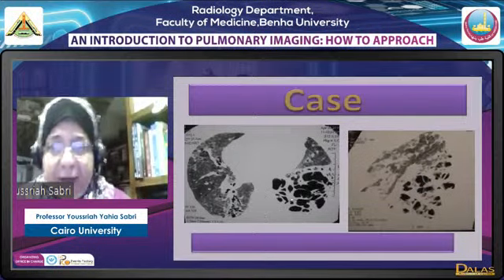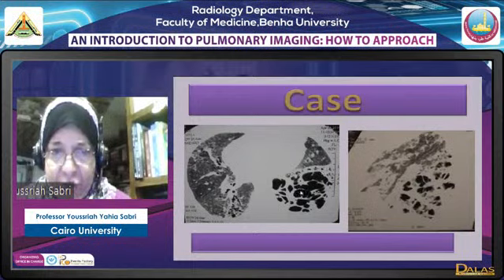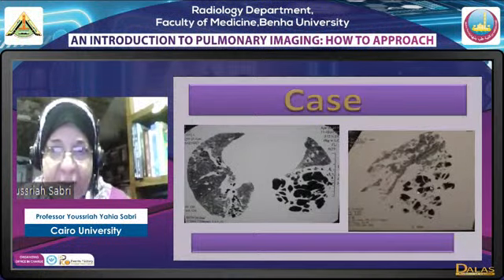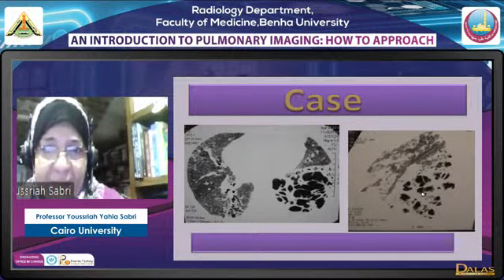Now we have a similar appearance here, multiple what looks like cystic, bizarre shaped cystic lesions together with opacities in between. But here we have shift of the mediastinum, of the fissure. There is mass effect here. The fissure is displaced by the lesion. This lesion actually could be lobar, and in this case, it could be segmental, it could be subsegmental, it could affect the whole lung.